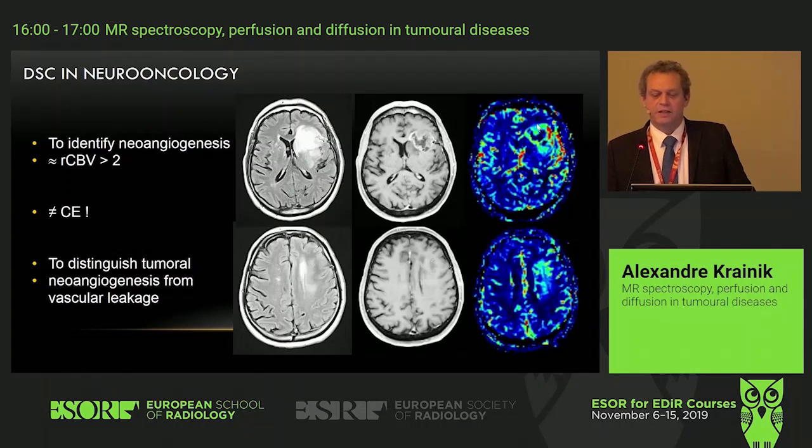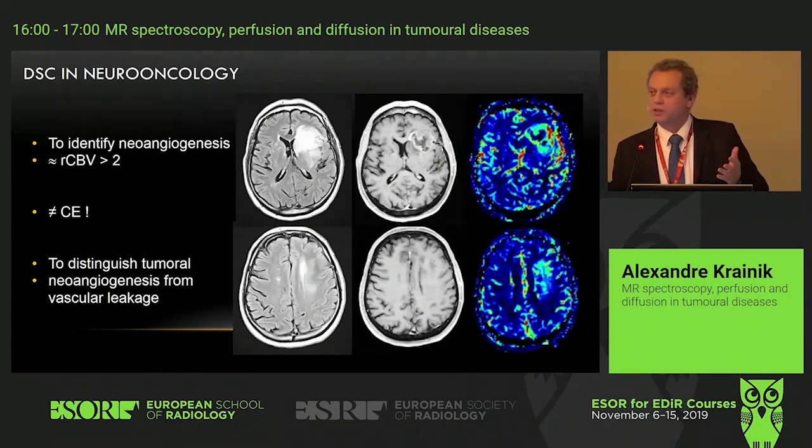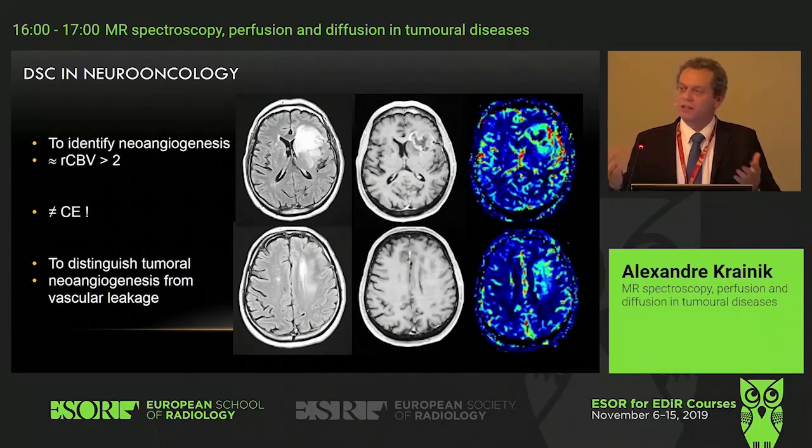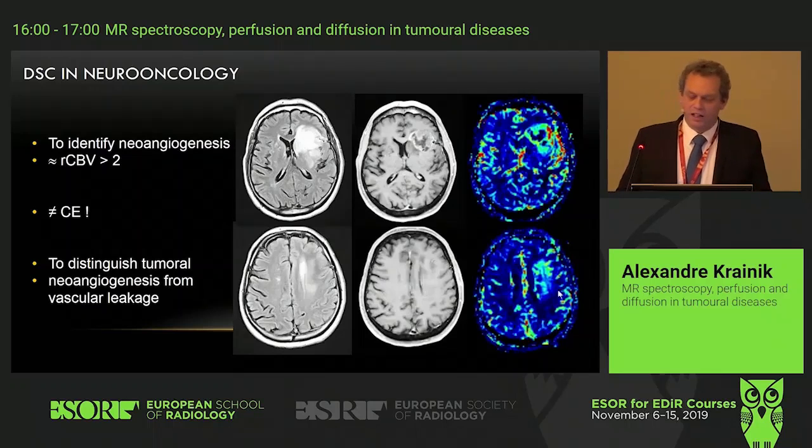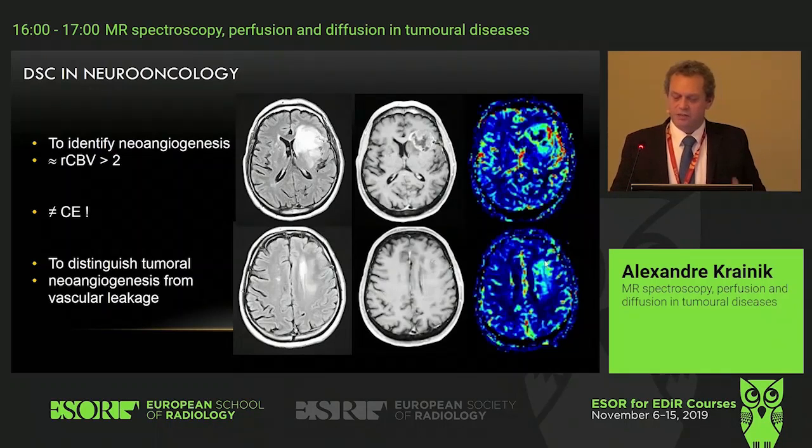Okay, then you can see, for instance, you have a lot of vessels everywhere. You don't always have an increase of contrast. Then to have this increase of contrast, usually you need to have a leakage. And once you have a leakage, your assumption that the blood-brain barrier is preserved is threatened in a certain way. It's not true anymore.